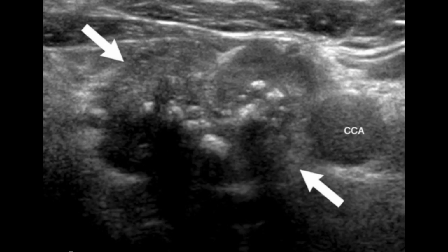Another example of the U5 malignant nodule for better understanding, have a look. This nodule is solid, and this nodule is hypoechoic. This nodule is giving some misty appearance because of its lobulation and irregular margin. Besides this, you can also appreciate microcalcification within it. So this is the example of papillary carcinoma, and here all the features fit in this nodule. It is hypoechoic, with lobulated and irregular margins giving it a misty appearance. So this is a U5 malignant nodule.